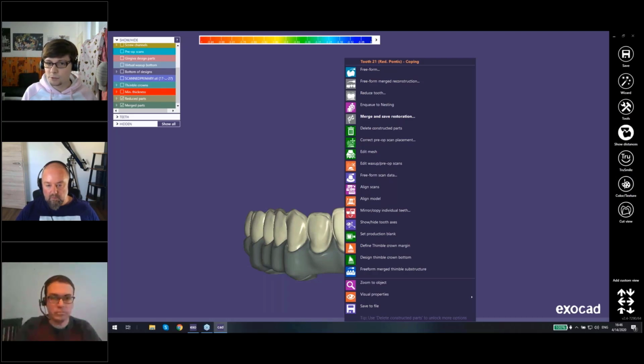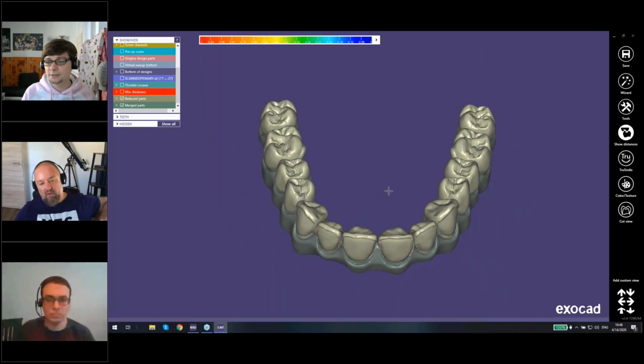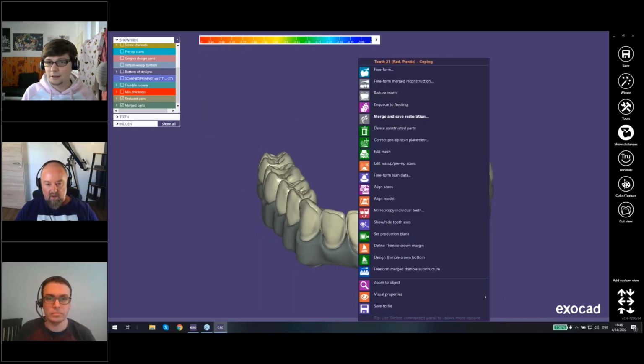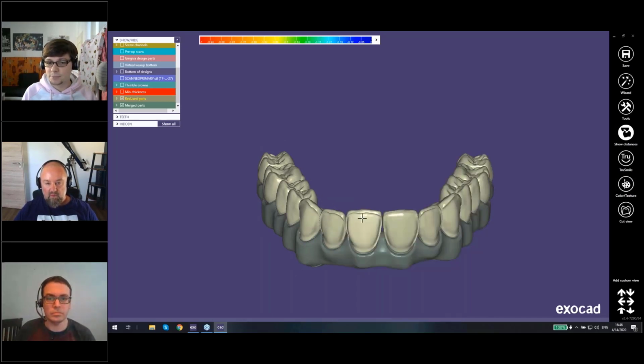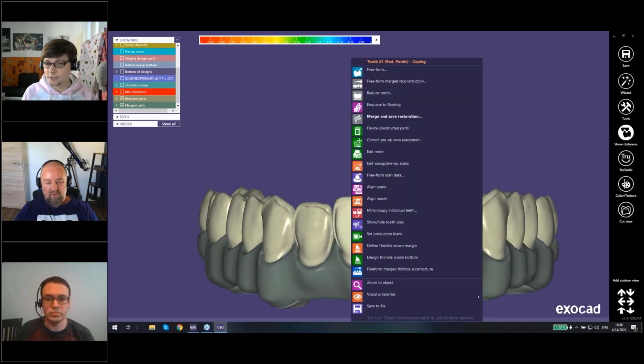I think it might not be possible yet. I'm not 100% sure. It's also something we might have to get back to you. I was sure that this is possible. I have to double check it. Because you can also theoretically set up connectors between the thimbles themselves, so it might be confusing for the software which parts to connect. But I think I remember that we have tested that.